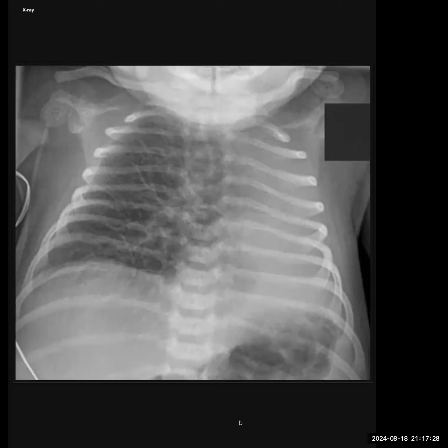So this baby presented with breathlessness. I'm provided with the chest frontal radiograph of an infant. On first glance, there is diffuse opacity involving the left lung region, and there is decreased volume. There is also evidence of reticulonodular opacities involving the right lung.